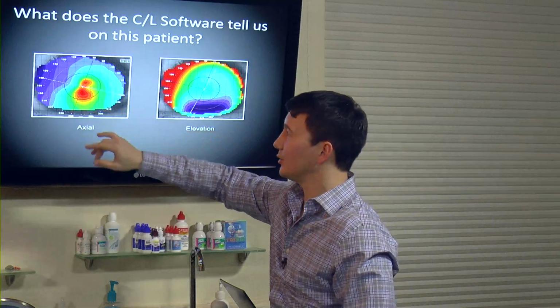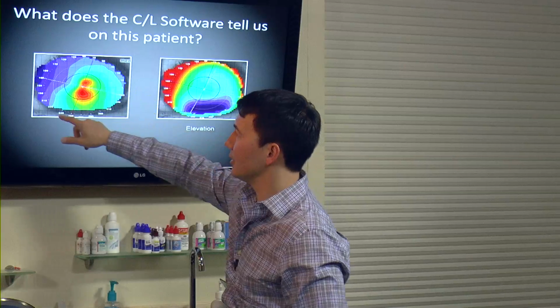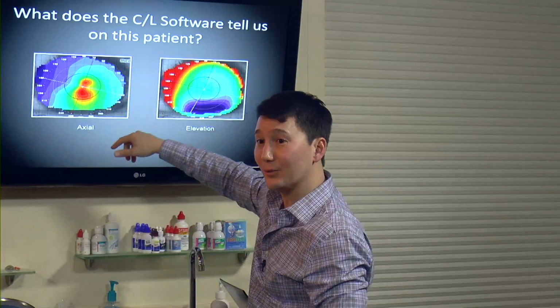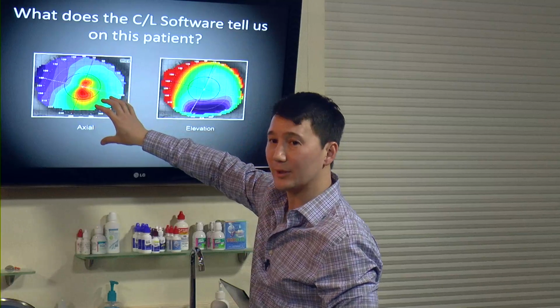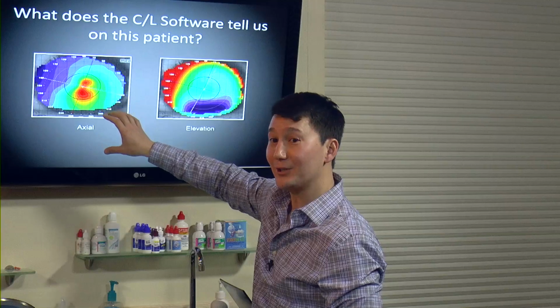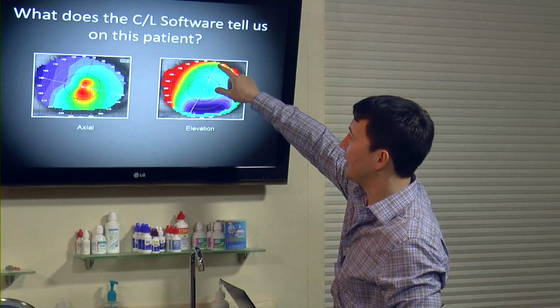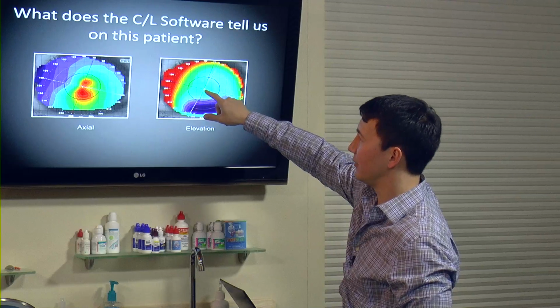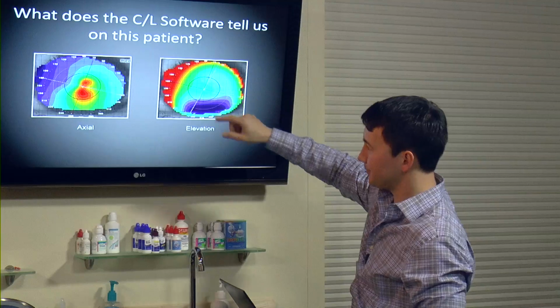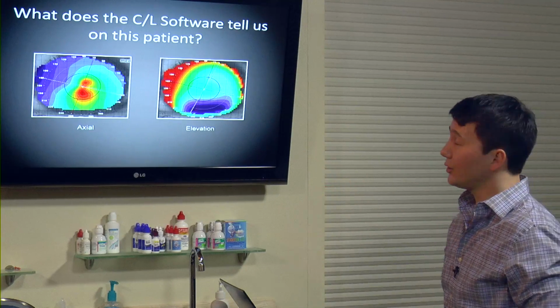When I look at this axial map, what I would see is a fairly symmetrical area of blue out here. I'm presuming I can land a rigid lens and have it align 360 degrees. The lens is probably just going to ride a little bit down and out on this left eye. But the axial map doesn't tell us elevation. And here's your elevation map saying the cornea is going to be high here, low here, higher here, not really high, but higher in relationship with these 2 points here. So there's some asymmetries here. I'm wondering, is a corneal GP going to work?